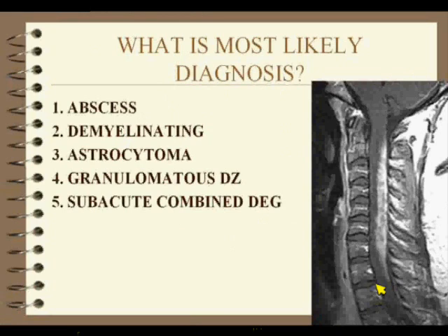Is it an abscess? Is it demyelinating disease? Is it an astrocytoma? Is it granulomatous disease? Or is it subacute combined degeneration?